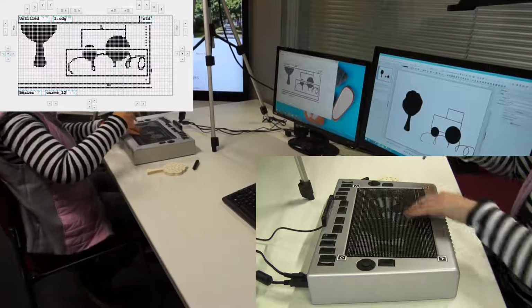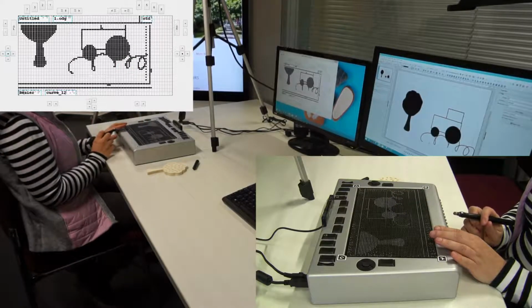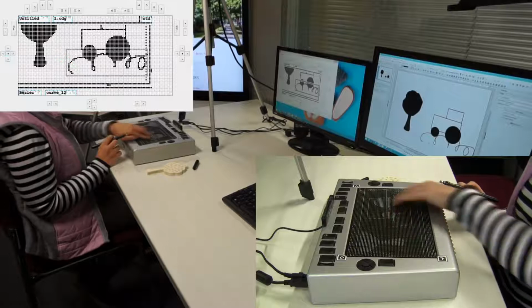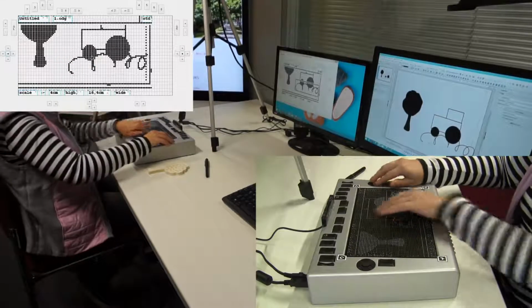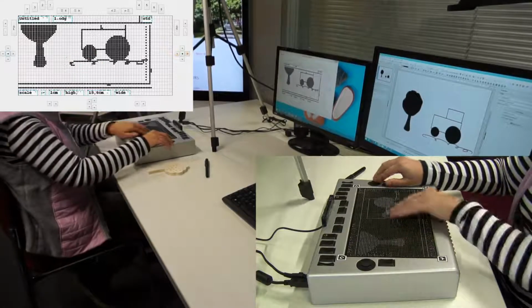The digitized path is immediately displayed as a traceable line underneath the pen tip on the tactile display. After lifting the stylus, the tracked path is turned into a smoothed curve and added to the drawing as modifiable shape. Users can produce open-line drawings or closed shapes with the pen. Users can even manipulate the single points of the created freeforms.